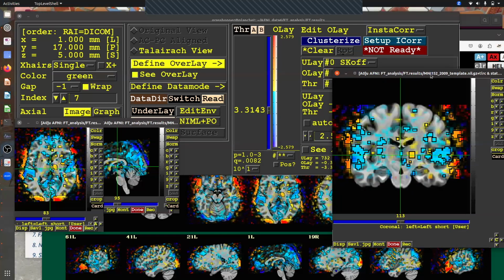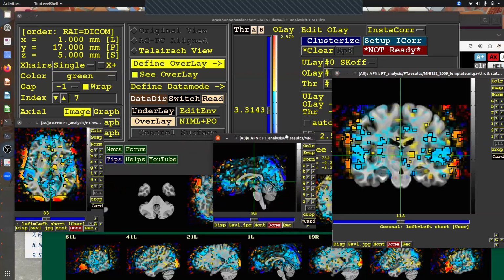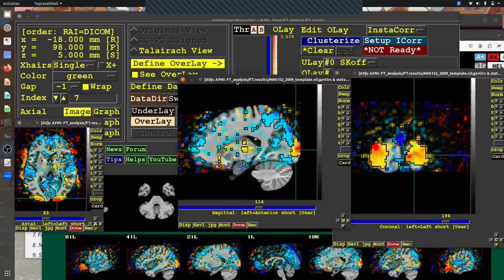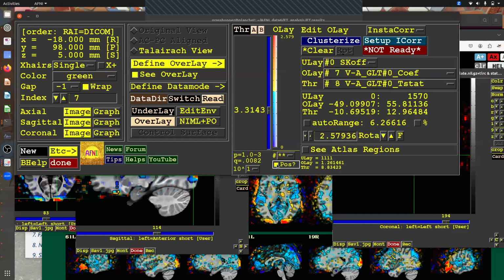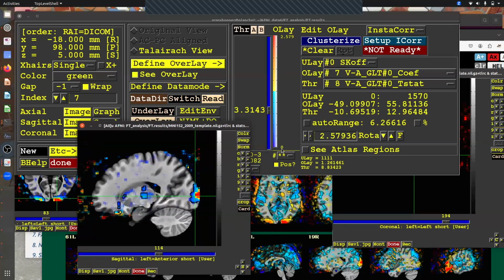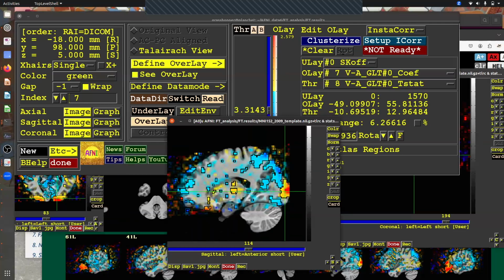The hot color ones are where visual is a lot bigger, and the cold color ones are where audio is bigger. Those two sides of the color bar separate the directionality of the difference. If I want to, I can turn off seeing the negative stuff, so now the color bar stretches from 0 and I'm not seeing anything negative, but most people look at it fully like this.